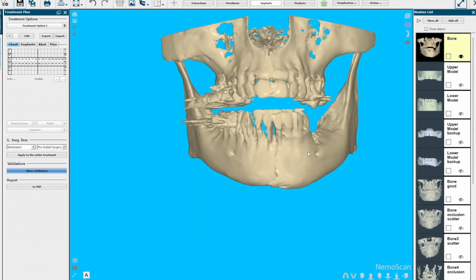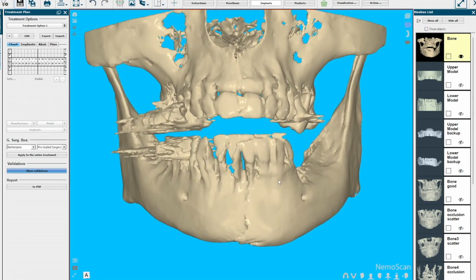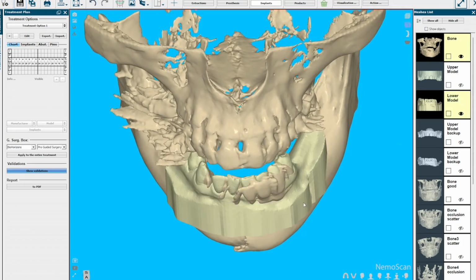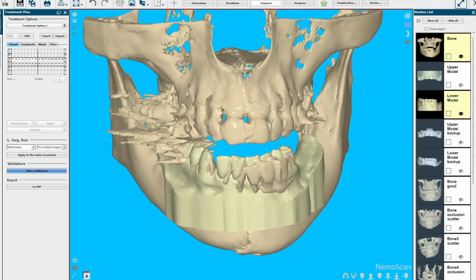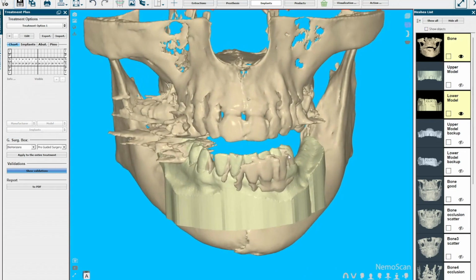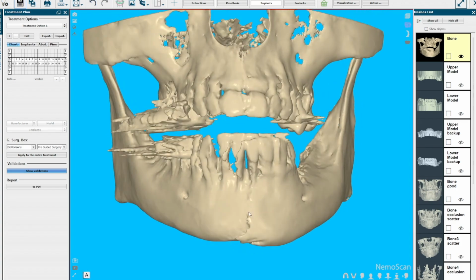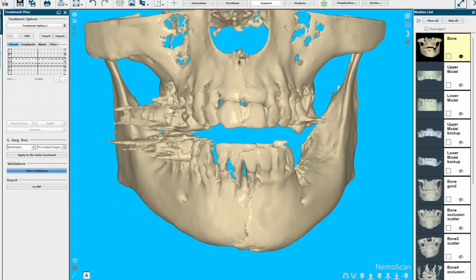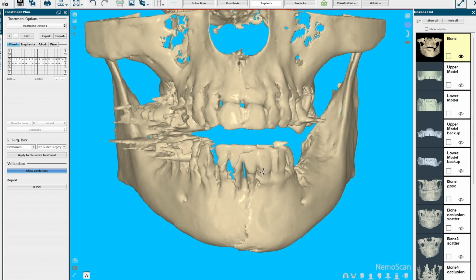Now, here's one more I wanted to address. This is something that happens probably more frequently than anything else, the double take. So we've got a row of teeth here and then a row of teeth here. Which one is correct? Which one's following the arch of the teeth? We're not entirely sure. So let's say we got the STL file here. We merged it with this one, but maybe there's something here, or this is the correct line. So we're not able to be sure because we got two of them and we don't know which is which. As you can see, this line goes all the way down to the chin here. So this patient shifted their jaw, or they moved while the scan was being taken.